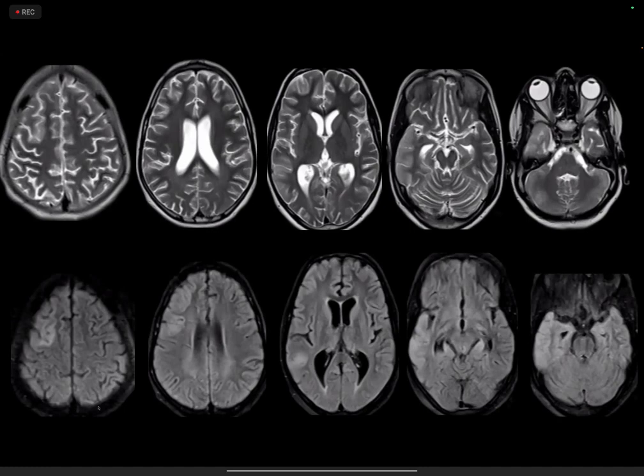I think I will think more of an autoimmune encephalitic process in this case, because the temporal involvement is more diffuse. It's not like MELAS or anything. Yeah, that's what I feel. The cortical thickness is not a gliotic type abnormality. MELAS, chronic sequelae. Only worry is that the cerebrum and cerebellum are showing significant volume loss. So whether that is pointing to something, especially the cerebellar volume loss.